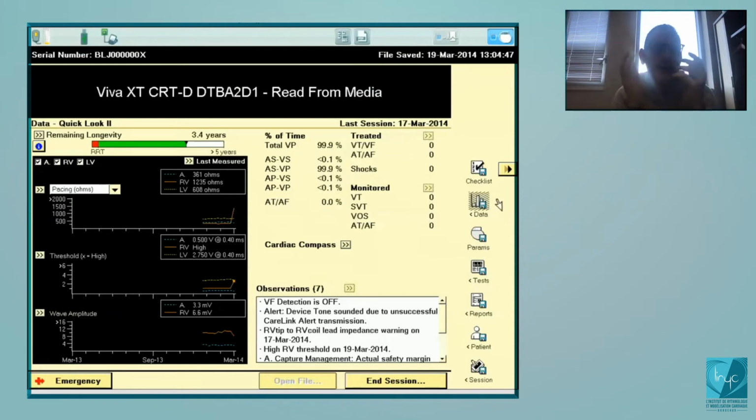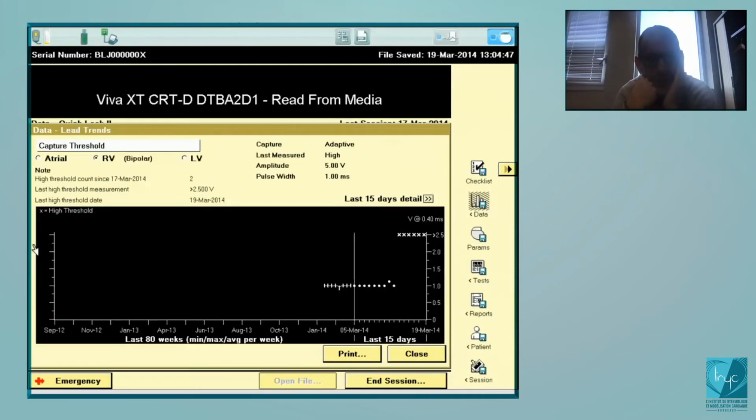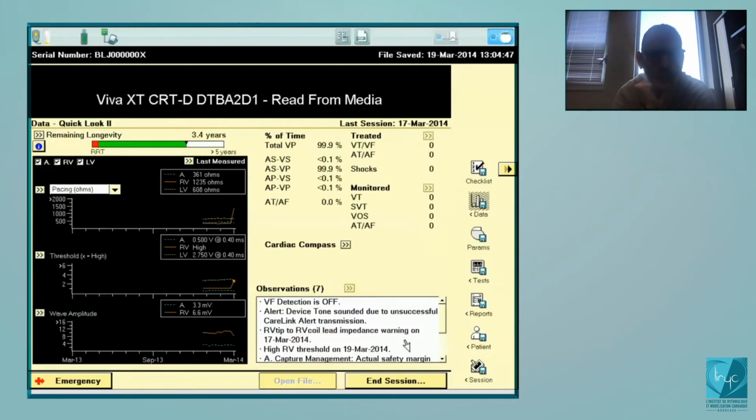And if you see the curve here, there is an increase of the pacing thresholds, there is an increase of the impedance, and there is also a decrease in the R wave amplitudes. So these signs are quite late. This is a patient with an obvious lead dysfunction. We're going to have a look at the tracings, but this is quite infrequent now. With all the algorithms and with remote monitoring, you can avoid these kinds of terrible situations.